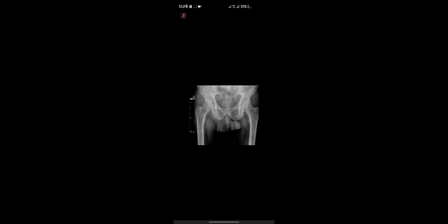Okay, so I've got an AP pelvis of a 73-year-old male patient with right hip pain. The hip joint is in normal alignment. There are no focal lesions of the upper femora. Looking closely, the acetabulum is intact, as are the pubic rami. There's an impression of lucency over the left pubic rami, but I think that's just projectional. But there is definite asymmetry overlying the sacral ala, and I'm concerned that there's a lytic lesion.